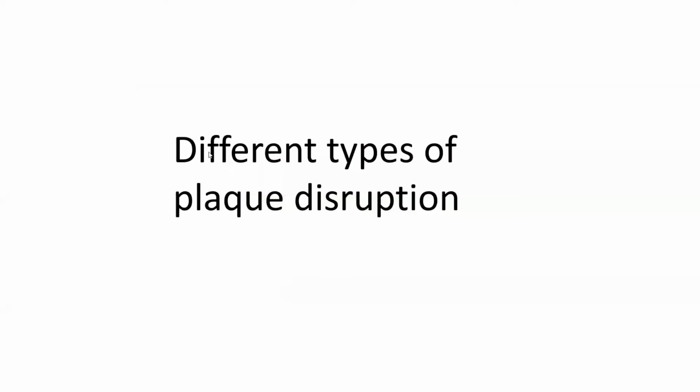So I will be talking about the different types of plaque disruption as seen by OCT. I've always been interested in that topic, especially when I was a resident. I always wanted to know what's the difference between plaque rupture and plaque erosion. People use those terms, and I hope I will be able to show you the difference in this presentation, okay?